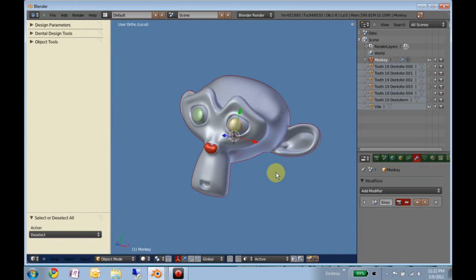Alright, I just wanted to introduce a few of the new updates that I've been working on, most of which are bookkeeping in nature, but a couple of which are functionality in nature. The main thing as far as function is I've added a new blockout feature for blocking out undercuts, and that actually ended up turning out to be a really convenient, efficient, and elegant way of making the whole inside of the crown anyway.